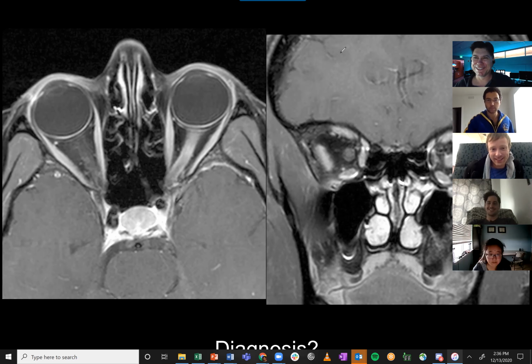If this is really enlarged, we might talk about an optic nerve glioma. If there's calcification around the outside, we might talk about an optic nerve meningioma. So if there was enhancement around the nerve, but the nerve itself was not actually enhancing, then we might actually talk about a meningioma. Does that make sense? Yes, it does. So cranial nerve 2 is different than the others because it's all central. It's all myelin, like glial. One thing, it never has the Schwann.